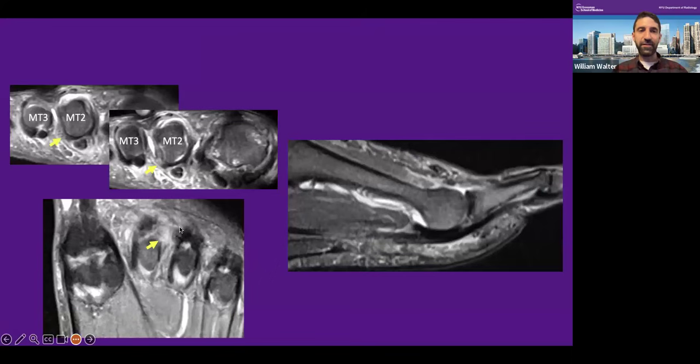So this is a plantar plate tear. These arrows are pointing to the torn tissue. This should remind you a little bit of the torn ligamentous tissue at the ankle. It's edematous, it's ill-defined, and we should be seeing, like on this image, that nice U-shaped dark tissue. You see it pretty well over here, and then here at the lateral aspect of the plantar plate, there's a tear. There's also a bunch of edema around the MTP joint.